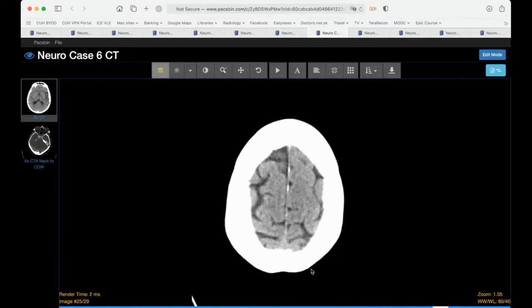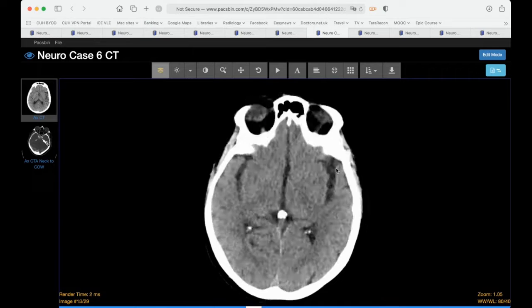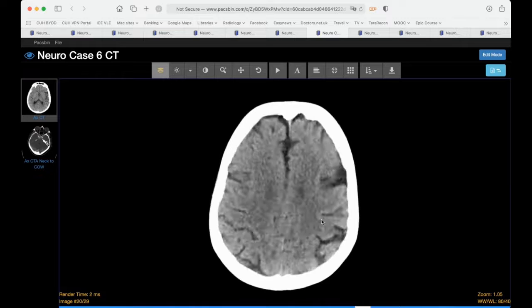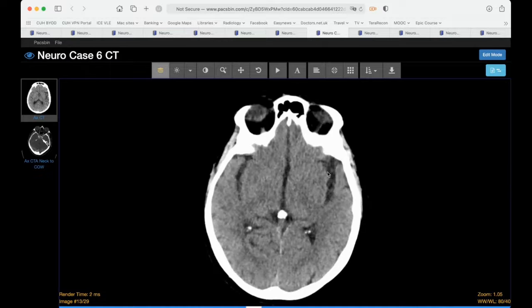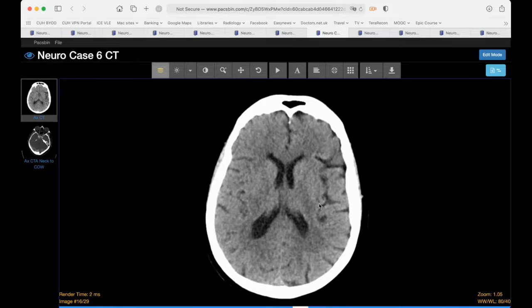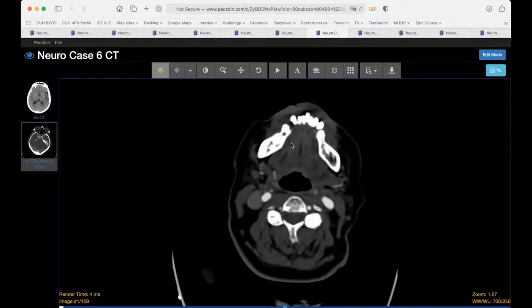So this is a CT scan done almost very soon after her initial presentation of low GCS post-op. So clearly no hemorrhage. There isn't much mass effect, not a clear-cut stroke, for example. And because there was a concern about infarction or stroke, she also had a CT angiogram. I've just given you a few images here.